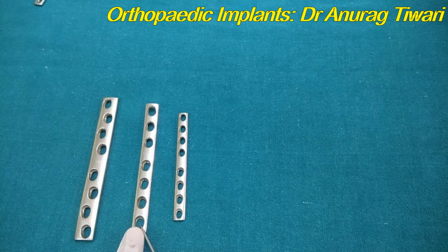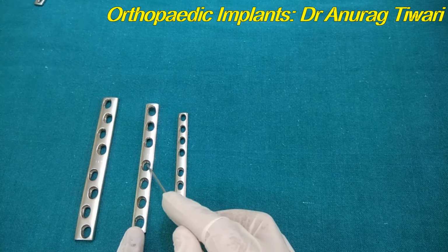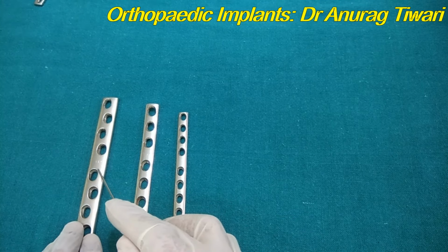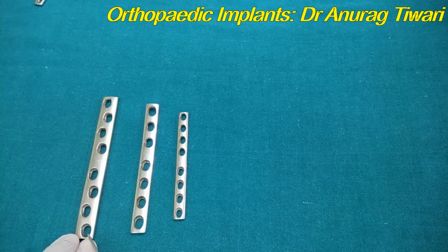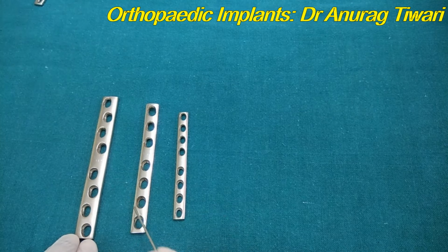The DCP usually has screws and there is a spacing in between the proximal and the distal fragment. You can see here that there is no hole. It is for the fracture site. So the fracture site will come over here. These holes are for one side of the fracture, that is the proximal fragment. This side is for the distal fragment. Like this they have divided it, and this space they have left to accommodate the fracture site.